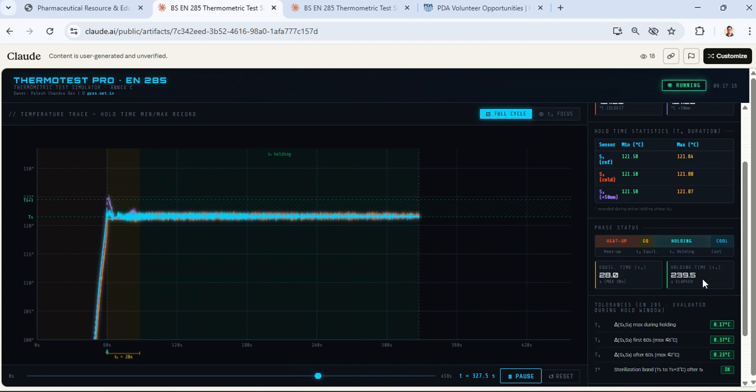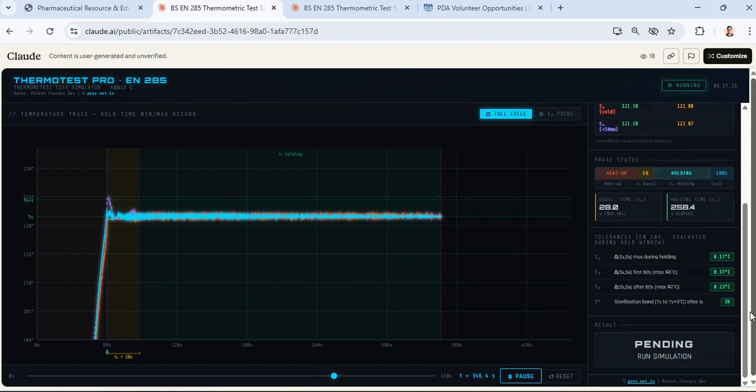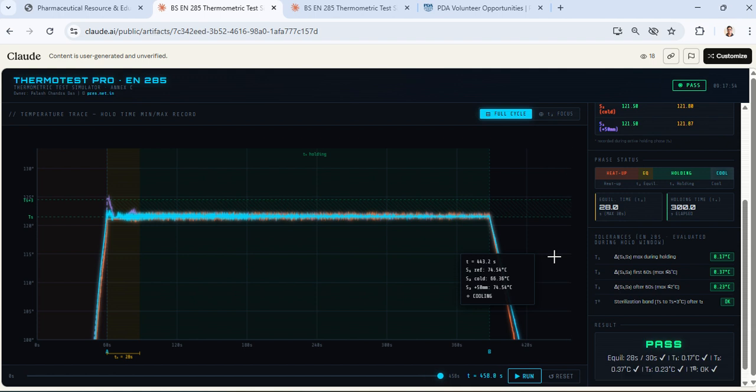We keep it short, so it closes quite fast. You don't need to wait for that, but it's quite interesting to see how the simulation is. Meanwhile, it's calculating all the delta values here, and based on that it will show the cycle status as well. We just need to wait till our cycle is completed, or you could drag this one to finish it quite faster. You see the temperature is getting down, and our cycle is almost completed. A few seconds. The bar is moving, which means our temperature is getting less than 100. Normally you don't see that value within the screen, so the cycle is still going on.